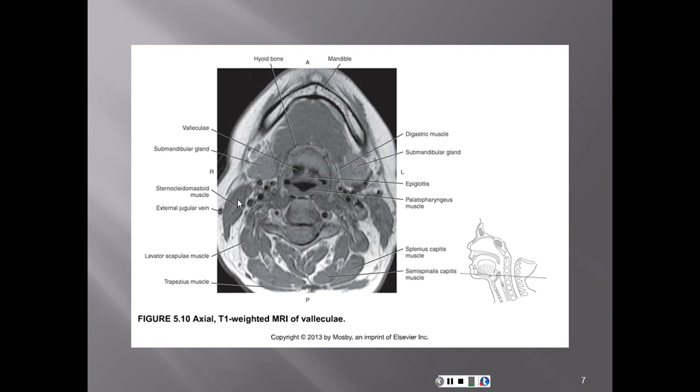And again, there's the important sternocleidomastoid muscle right there. So over here we have the sternocleidomastoid muscle right there, and the levator scapulae muscle right there. They marked it over here. Important muscles of the neck. When we talk about the neck, about 50% of the discussion is going to be pertaining to the musculature of the neck. We would talk about the oropharynx, we'll talk about the nasopharynx and compartments, but a very important aspect of the neck is understanding the muscles of the neck.